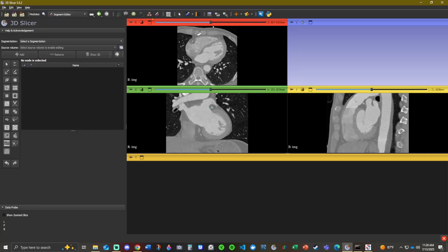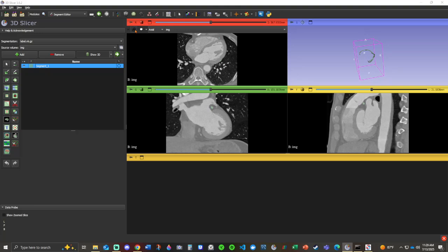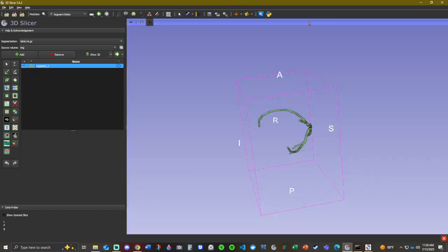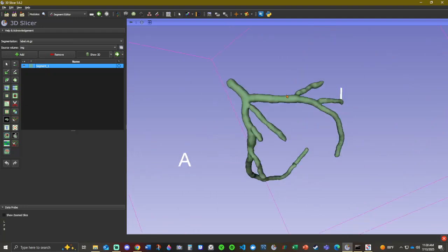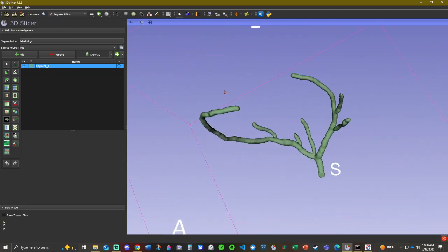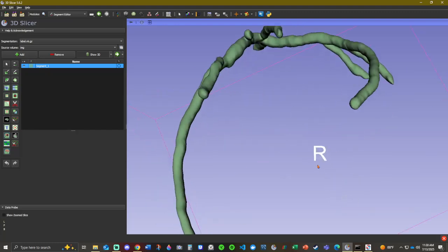All right. So you've got a whole bunch of different things. You go to the segment editor, it should look like this. Select label, select your background, show 3D. Click this up here to make it show. You can even show the volumes by clicking that, then the eyeballs, but we don't need that right now. Let's focus in on this. Right, so this is your label. It's unclipped. You can see the ends are not clipped.